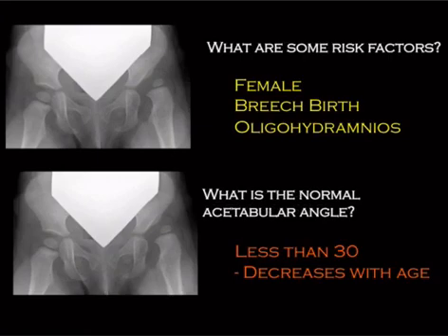Now, the normal acetabular angle is less than 30. So this one would be less than 30. This one is clearly more than that, right? And this actually decreases with age.